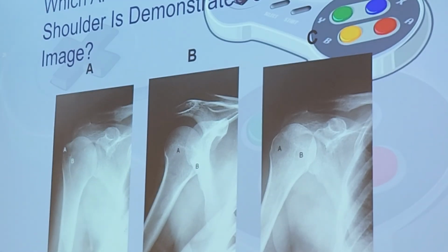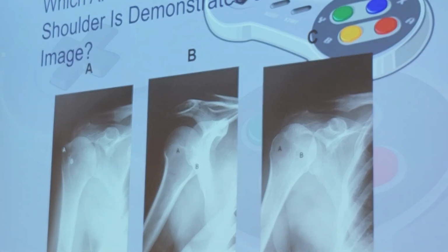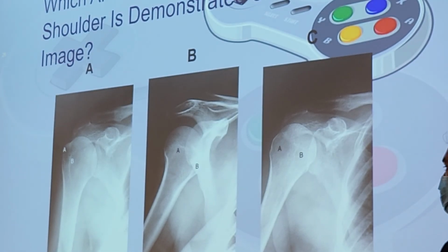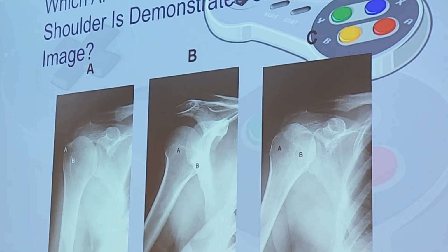Prone view. Very good. So you're kind of seeing the vast amount of questions that can come from those three images alone. So don't focus on one aspect, but look at all the anatomical aspects for those images. What anatomy is where, what's it doing, what's in profile, what's perpendicular, what's superimposed. How's the hand resting?